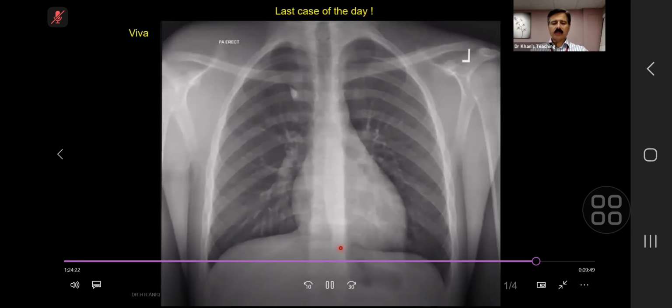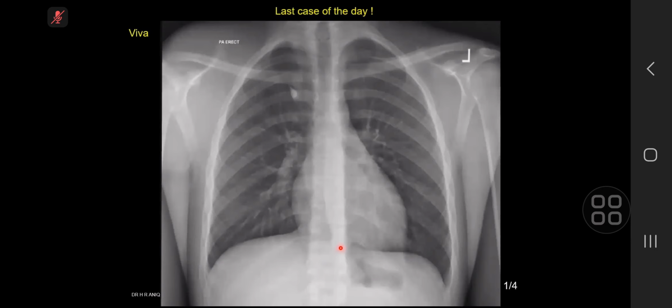Anything happening to the scapula? There's some lucency around the superior glenoid, the superior angle. Yes, so the spine of the scapula, there appears to be an aggressive periosteal reaction on the right-hand side.